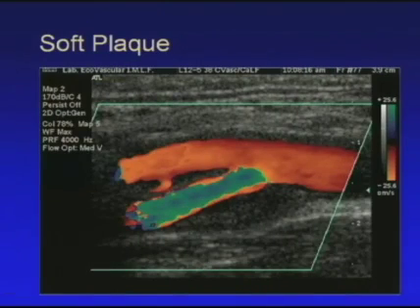This is an example of a soft plaque. We observe a hypoechogenic structure. It means that the components of the plaque are soft, with high potential of embolism here. Pay attention to that. And we are observing that the plaque grows not only toward the external portion, the adventitia, and the growing will stop depending on the compliance of the adventitia of the carotid artery, and then the plaque will start to grow inside the lumen.